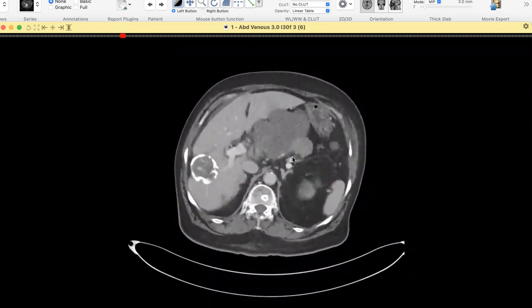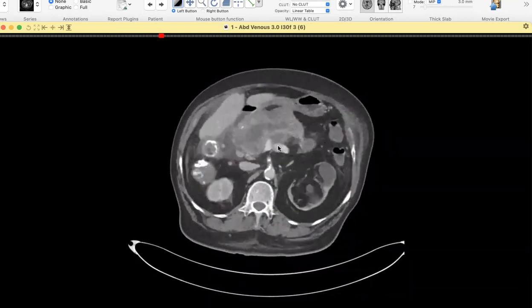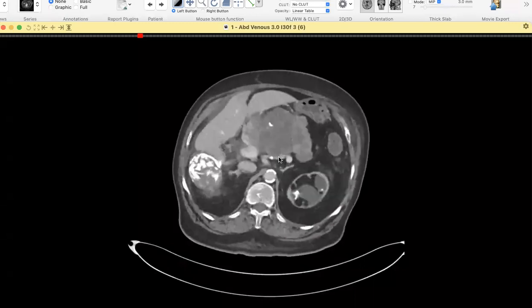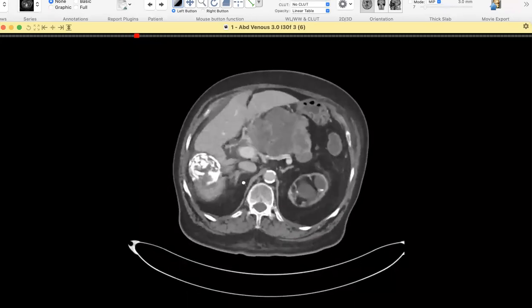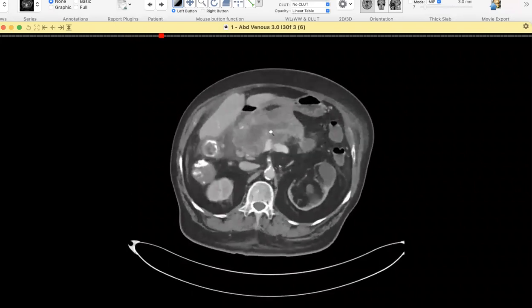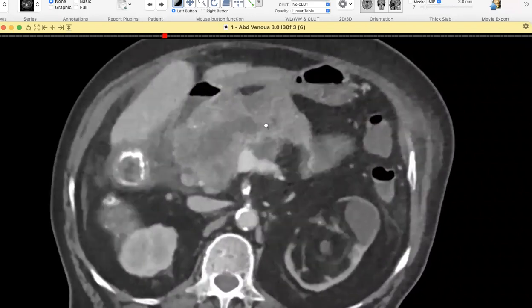Okay, so generally speaking, you would think of a mucinous cystadenoma in this case, given this appearance. Given the age, if there is additional fat stranding, any lymph nodes or anything you see, mucinous cystadenocarcinoma. But over here in this case, you have a dilated main pancreatic duct, right?